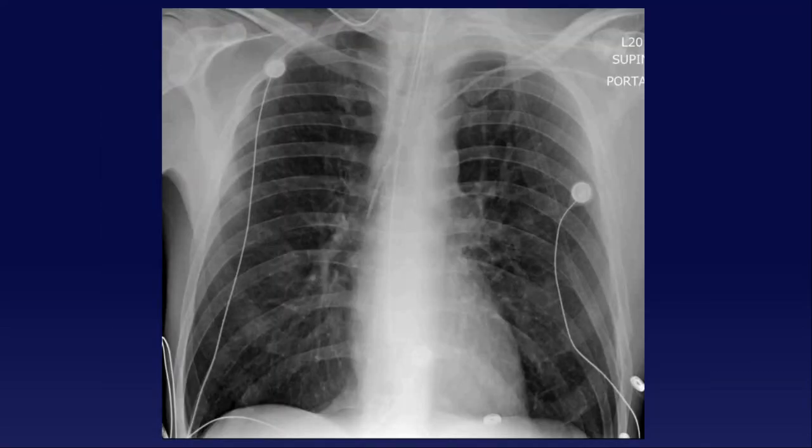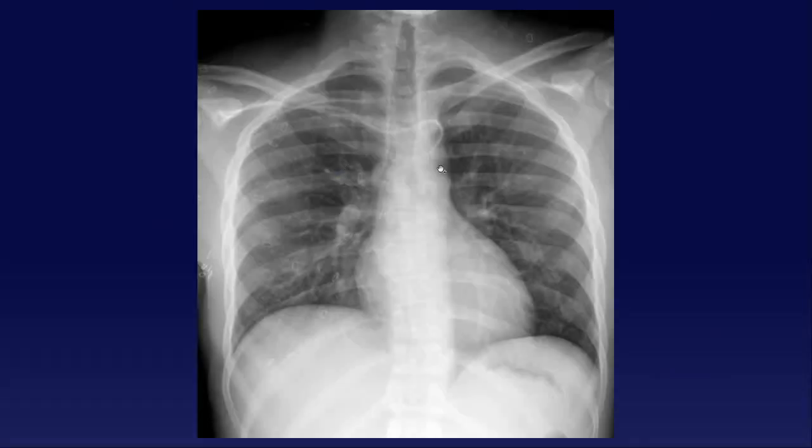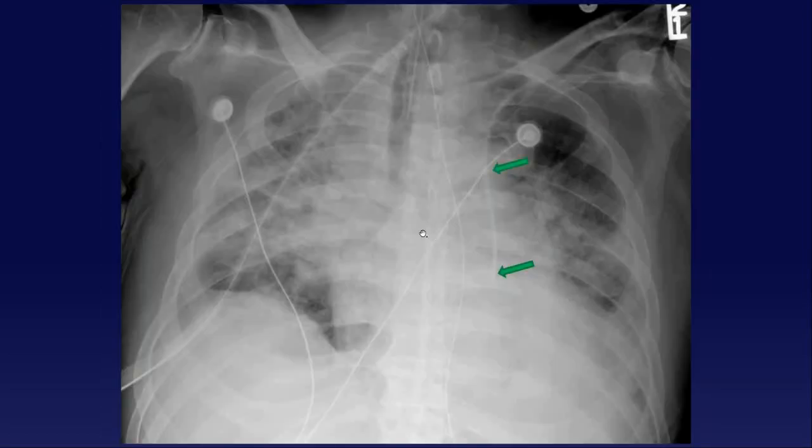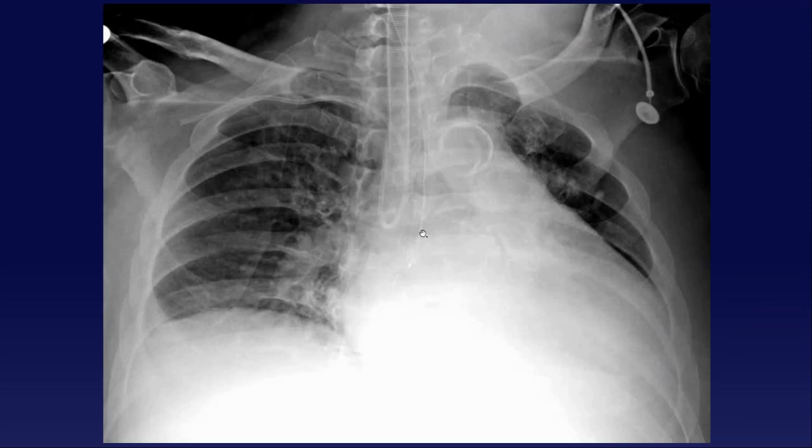All the catheters I've shown starting from abnormal position here going forward are abnormally positioned. Some of them are worse abnormally positioned than others. You definitely don't want to use catheters that are potentially in the arterial or mediastinum, like an extravascular catheter.